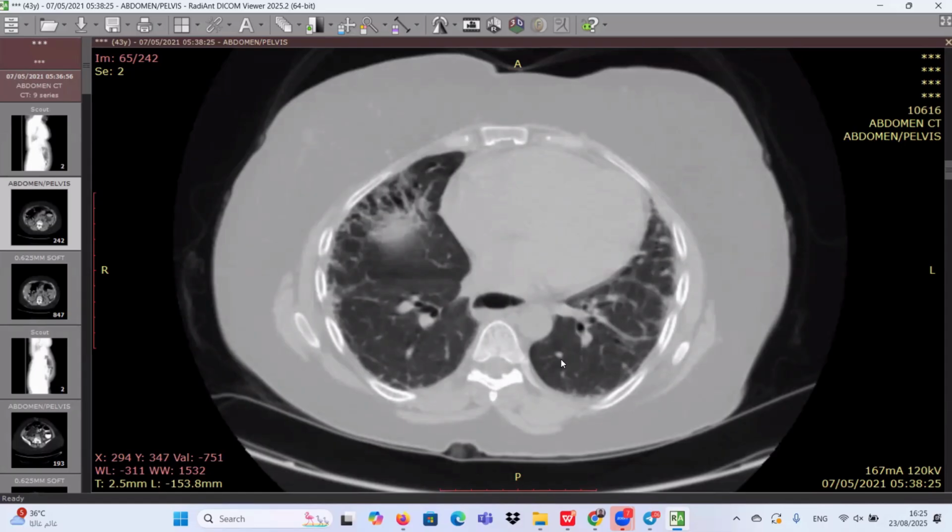How can we link these findings? We have a possibility of scleroderma, and indeed, this is a case of scleroderma, and scleroderma cases have a high risk of fecal impaction and bowel obstruction because of impaired motility of the bowel loops. Also, one of the GIT manifestations is decreased secretions of the bowel loops. But we have here a classic case of scleroderma. And once we introduced the rectal enema contrast, the fecal impaction was dissolved and the bowel obstruction was totally resolved.